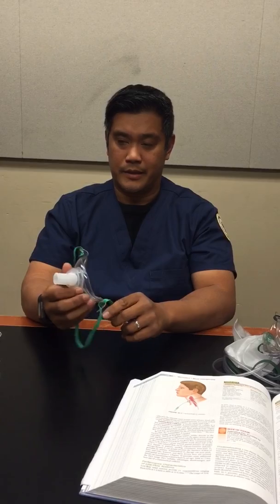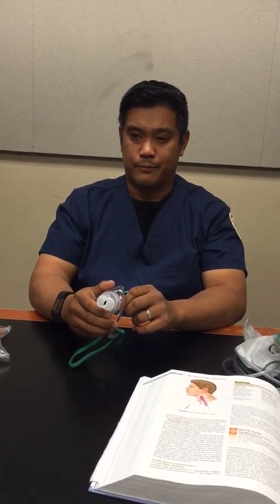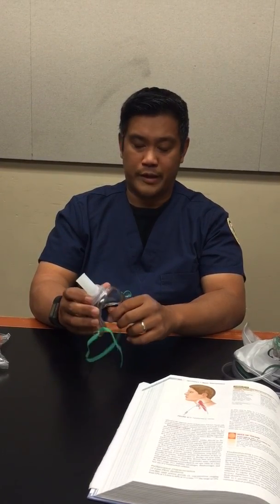And we're looking at now the trach collar and the face mask. So we'll start with the trach collar, which attaches to a large volume nebulizer. It has a flow range of 10 to 15 liters per minute with an output flow of 60 liters per minute. It has a fixed FiO2 stability, and it provides a FiO2 range of 28 to 100%. The advantage is it provides temperature control as well as extra humidification.